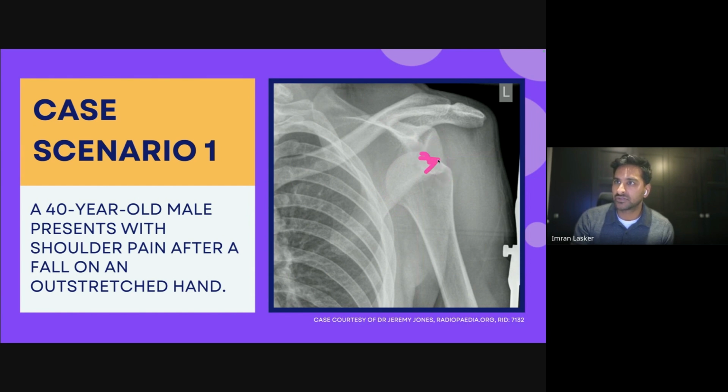You can see the edge over here as well. This may impact with here, and therefore end up with a bone contusion or an injury or even a fracture. Very, very important to see that this area doesn't look like it's fractured and fallen away, because that can result in instability later. Yeah, this can be quite a significant injury.